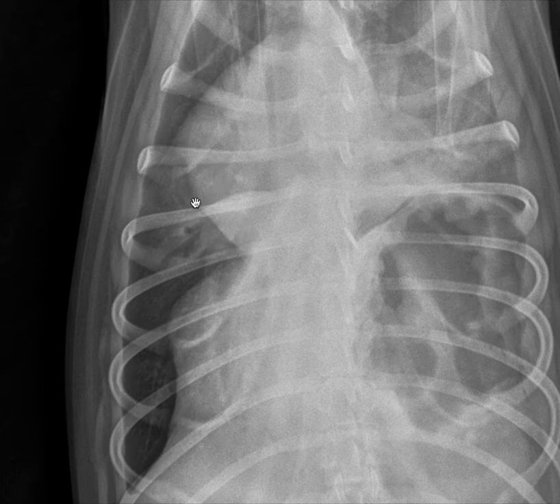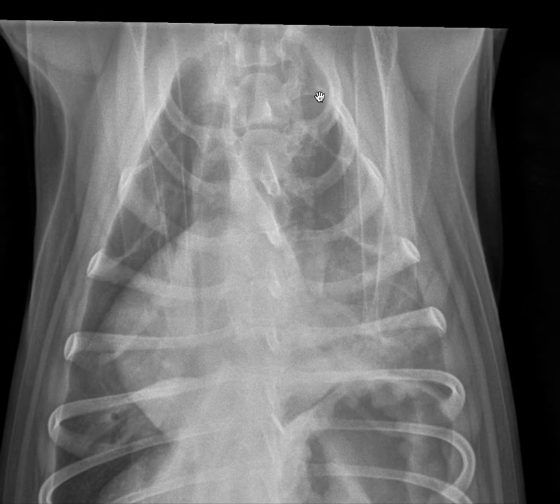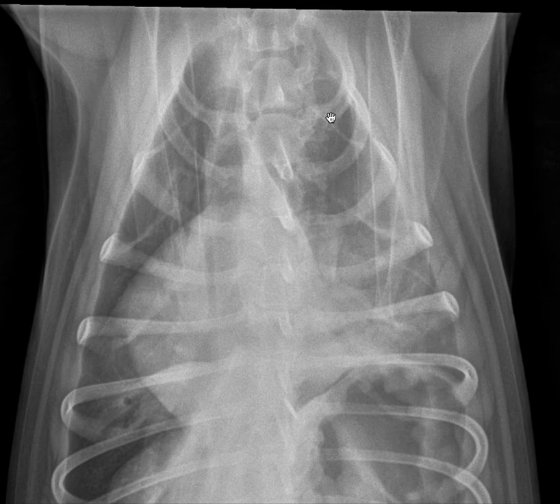In the region of the right middle lung lobe, for me, I see a mild increase in soft tissue opacity. On the left, the lung is partially obscured by this pathology here, and we can see that there's a focal alveolar pattern. I would characterize this as an alveolar pattern because it has increased opacity, and I don't see pulmonary blood vessels. It's even causing maybe a little bit of a lobar sign. The left cranial lung lobe area looks much more normal.